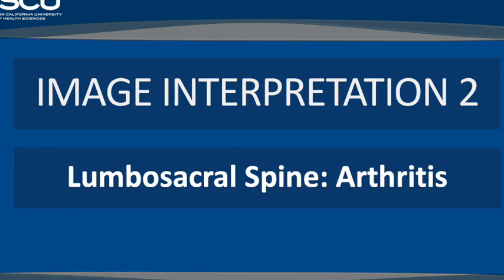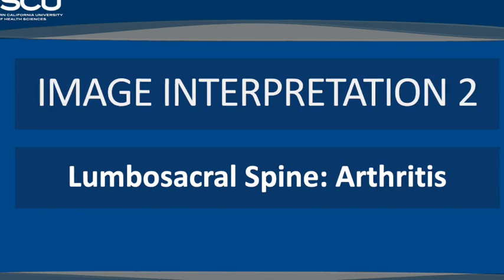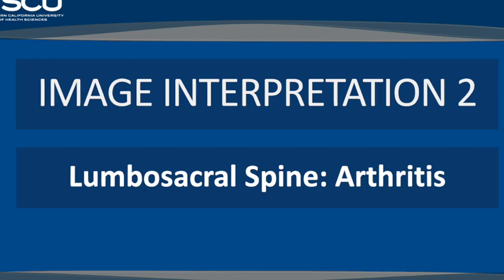In this case, we are dealing with neuropathic arthropathy, a condition that can occur in the thoracolumbar spine due to various underlying causes. These include syringomyelia, tabes dorsalis, caused by syphilis, and diabetes mellitus. Neuropathic arthropathy typically presents with a hypertrophic pattern, characterized by the 6 Ds: distension, dislocation, disorganization, destruction, debris, and increased density. The image illustrates neuropathic arthropathy at the L2/L3 level, showcasing the characteristic radiographic features associated with this condition.